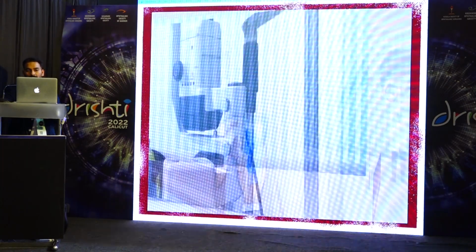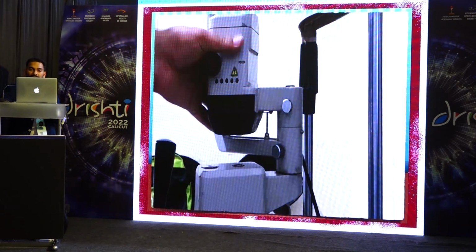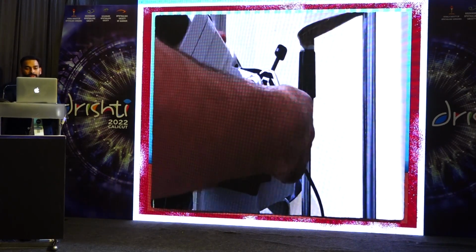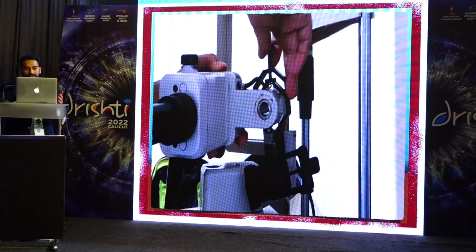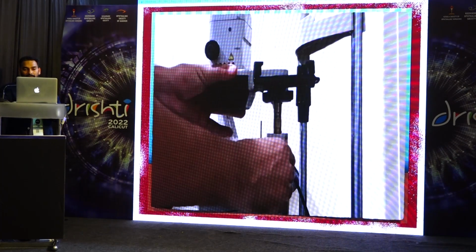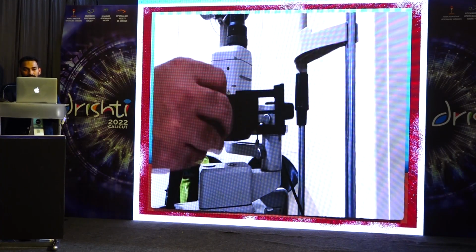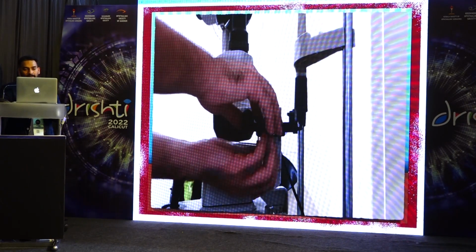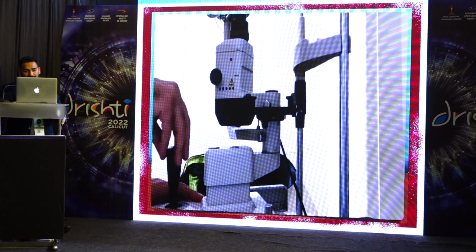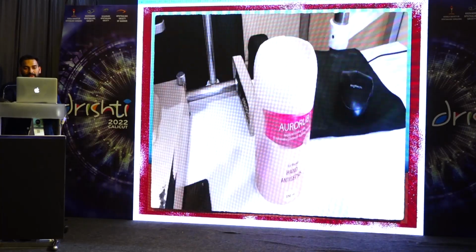Over here we'll show you how you can attach it. Either you can attach it by removing the illumination part, or you can even put it on top of the illumination part, if there is a small hook. The phone adapter which we saw for smartphone slit lamp photography, the same adapter we are using here, but the arrangement of the smartphone is reversed. Usually you keep it towards the connecting adapter, right? So we keep it reversed. This is an attachment to the slit lamp. It will move with the joystick. And this is the attachment of the smartphone to the slit lamp.